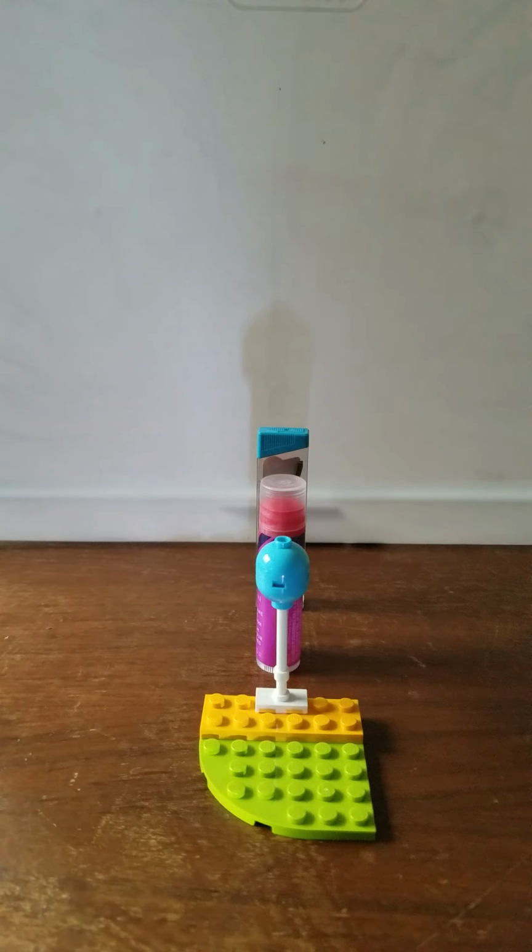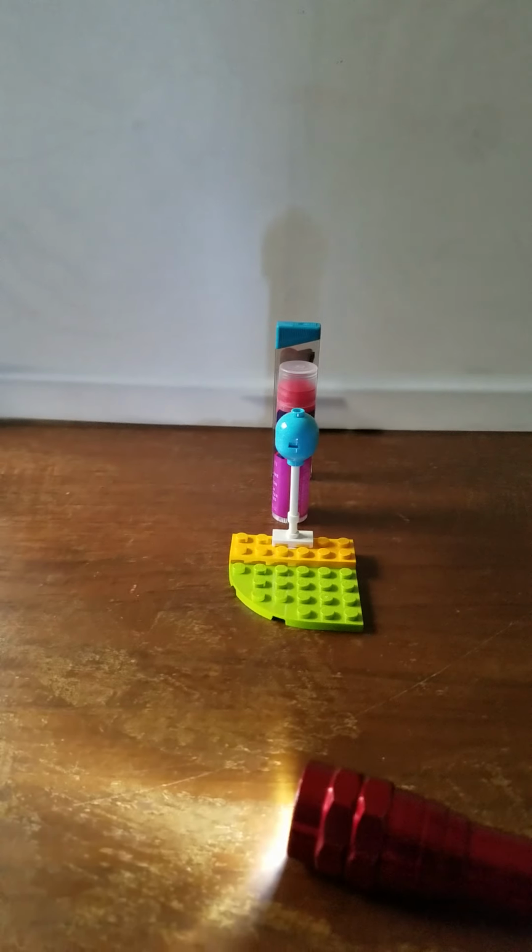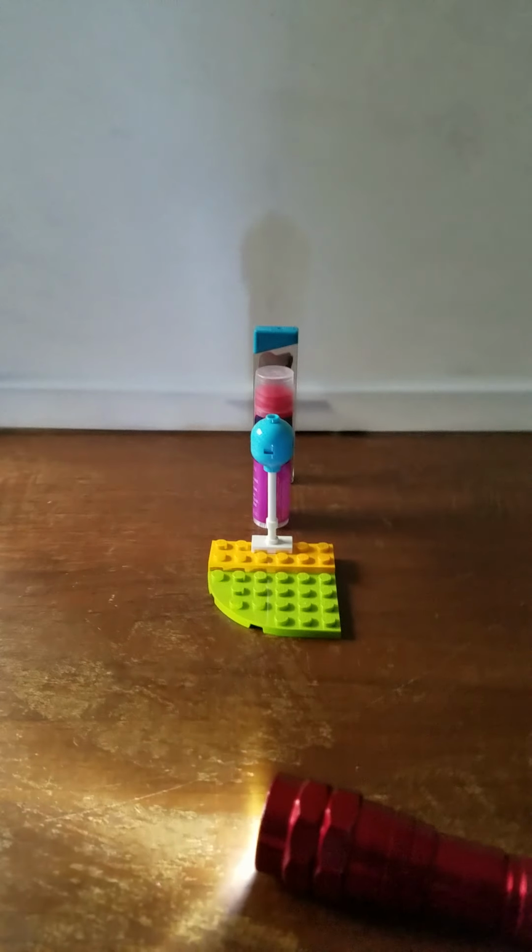Hi everyone, I'm going to try and demonstrate to you the Buccal object rule. This probably is not a perfect demonstration, because I don't think all the elements are acting exactly like they would in an X-ray, but I think it gives at least somewhat of a good visual demonstration.